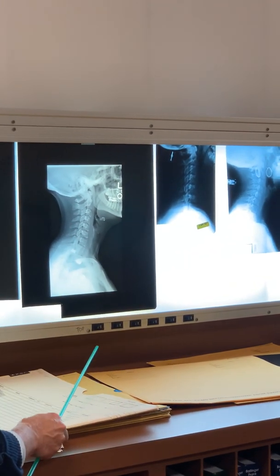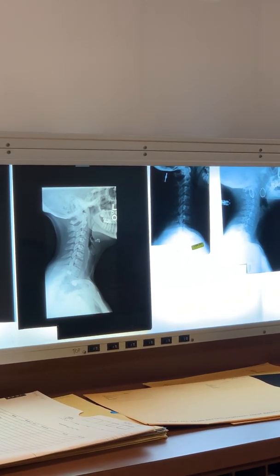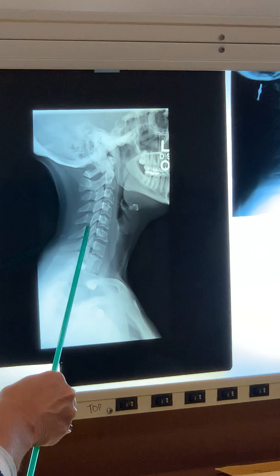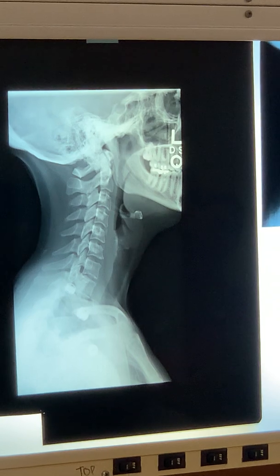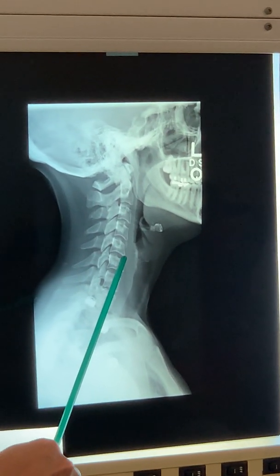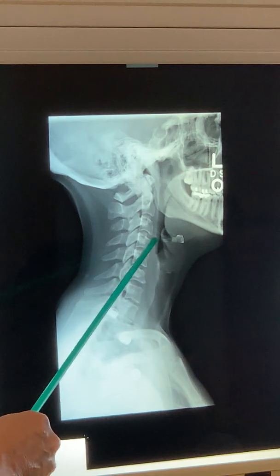All right, so the lateral cervical opens up what? What does it demonstrate? We see intervertebral disc spaces, and we see the apophyseal joint. Which apophyseal joint is it? That's a trick question. It goes all the way through, so you see them through and through, the apophyseal joints. See the little lip on the bodies? That's why we sometimes angle on the obliques and always angle on the AP, because of their downward slant.